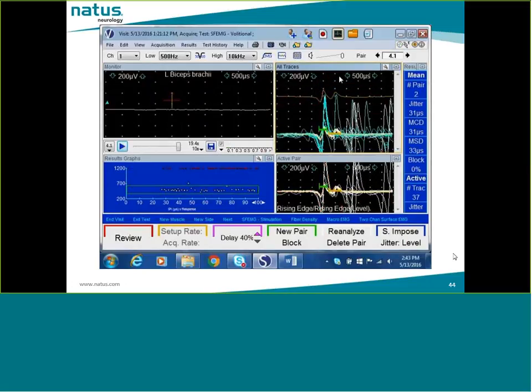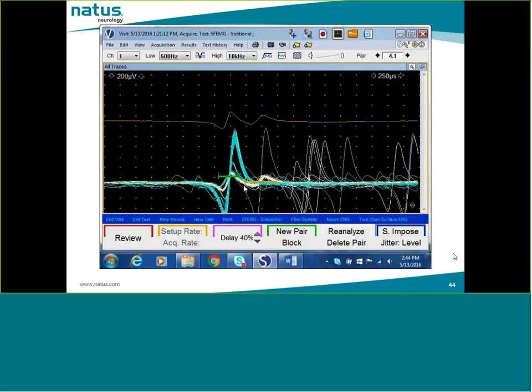Let us look at all the signals. Here is my start window, here is my stop window. These were the automatic positions selected by the program. The start window is usually left at the trigger location. While this voltage level may be good for triggering, it's not optimal for measuring the interpotential interval. I'm going to bring it on the sharpest portion of the rising edge.